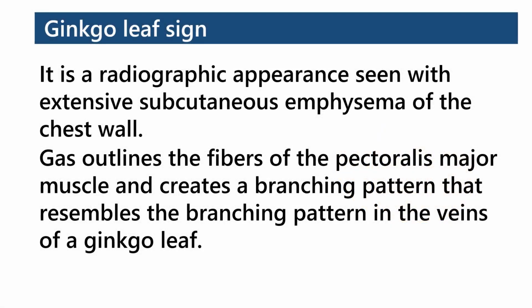Ginkgo leaf sign is a radiographic appearance seen with extensive subcutaneous emphysema of the chest wall. Gas outlines the fibers of the pectoralis major muscle and creates a branching pattern that resembles the branching pattern in the veins of a ginkgo leaf.